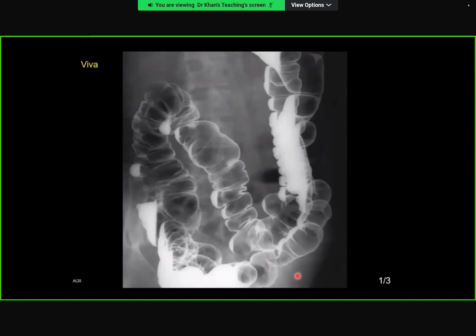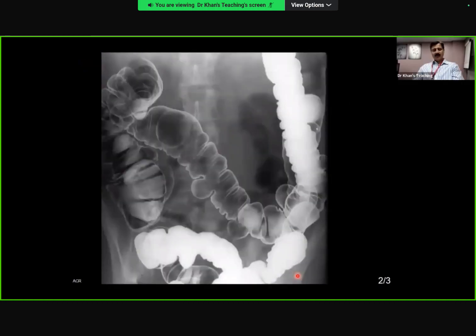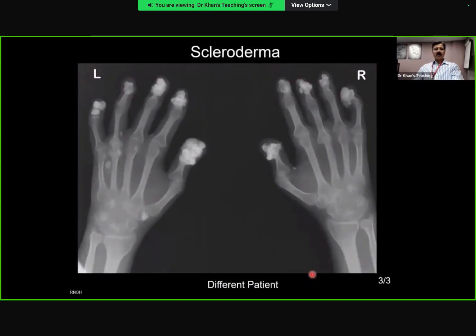Thickened fold, or no, it doesn't look like a thickened fold. Okay. So what comes to your mind? Oh, I've written it here. So that's a giveaway. But I'll take over. Thank you very much. And I'll give you a break after I give my explanation on this film. And after the break, it will be candidate 4.